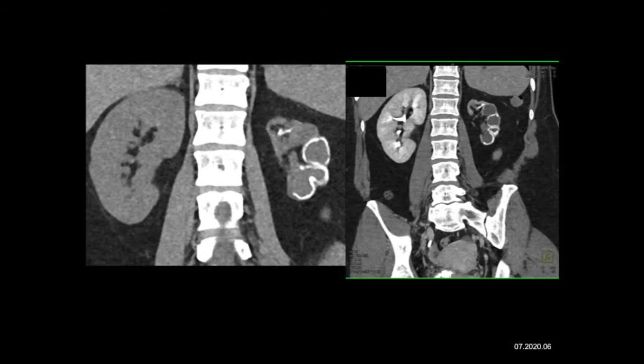I guess you could consider chronic pyelo because that gets calcification, but you get small kidneys and you get punctate calcifications. This appearance is strange. It's not a renal cell carcinoma.